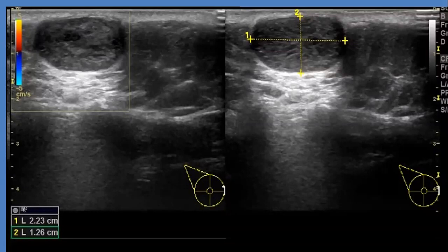Okay, one issue, but it is within the anterior, subcutaneous part, so still it can be related to the breast tissue. No surrounding glandular tissue. Okay, maybe, but still it can.